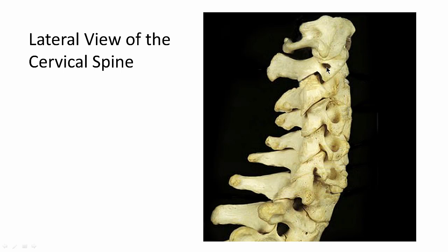All right, what do we have right here? You can see them here. That's a transverse foramen. Okay, that's not the intervertebral foramen. Transverse foramen. Okay, next. So that's C2.